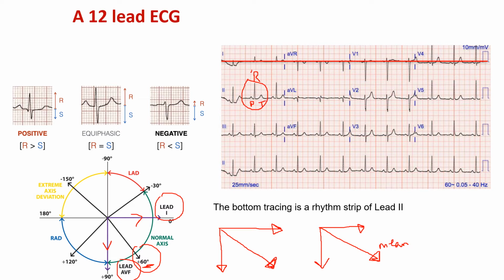Again, we're going to be concerned more about that QRS complex. Here's the R wave, here's the S, here's the T wave, and here is the P wave.